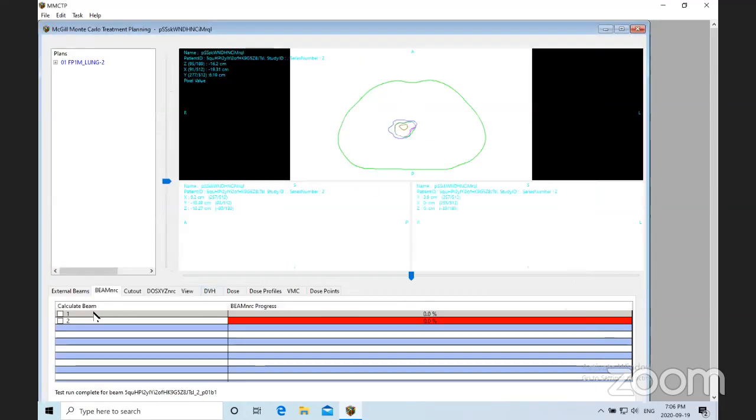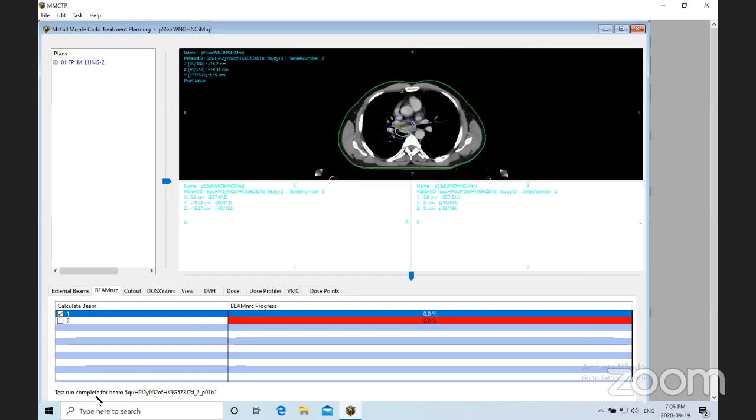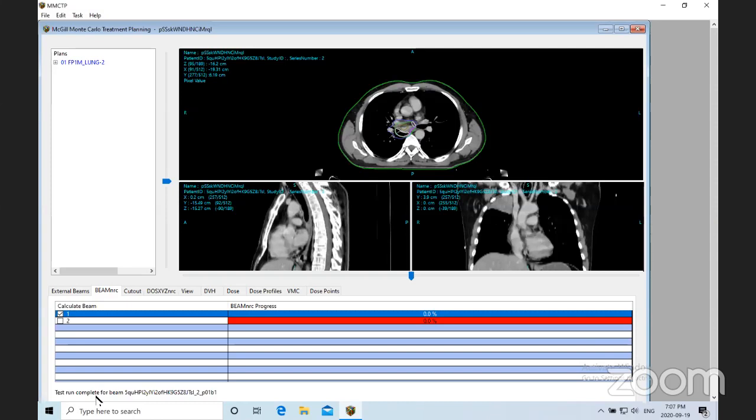in order to submit a job for a calculation, you take this thing, and now you will start. Now it will say created the input file and then an FTP or copying to the cluster, or where the EGS engine is.